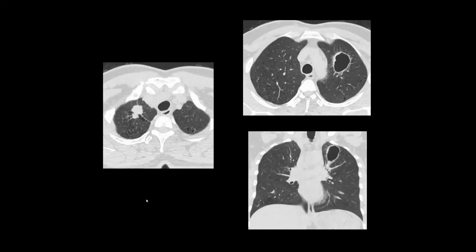Now, this is one patient who came to us where they were planning to do a CABG. Before that, the chest x-ray showed something. You can see that there is a well-defined spiculate pattern in the right lung apex. The PET CT was done. This showed uptake, and this was biopsied. It turned out to be an invasive adenocarcinoma. Now, what I would like you to notice is this lesion.